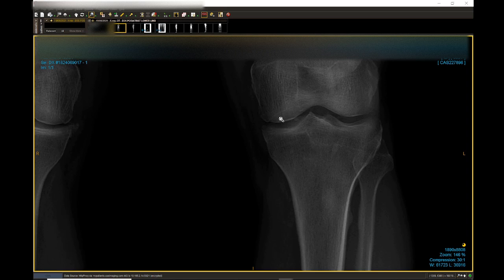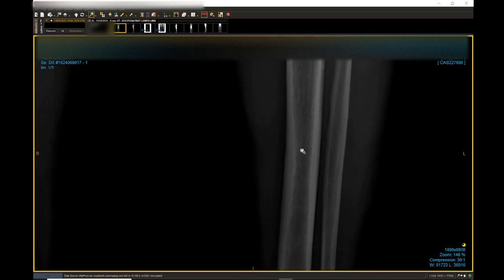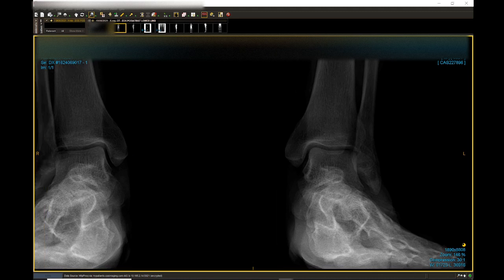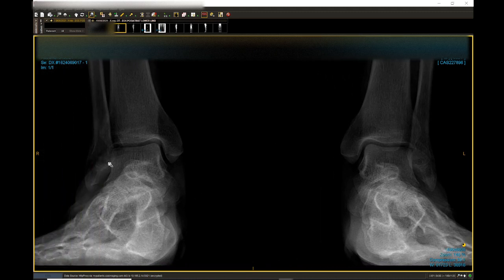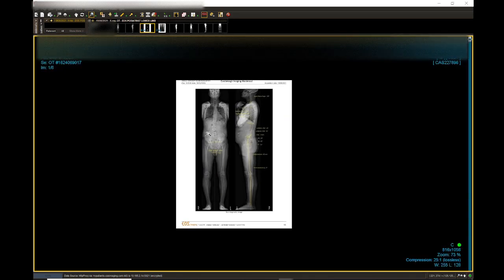Again, there, same thing, medial knee arthritis, a bit of spurring top and bottom. All right, at the same time, you can scroll down and have a look at the ankle joint. All right, unfortunately, it doesn't give good x-rays or good images of the actual feet. It's all cluttered, but it gives you a sort of a nice look at the actual ankle joint. And so that's what, as a podiatrist, we would probably use it for.